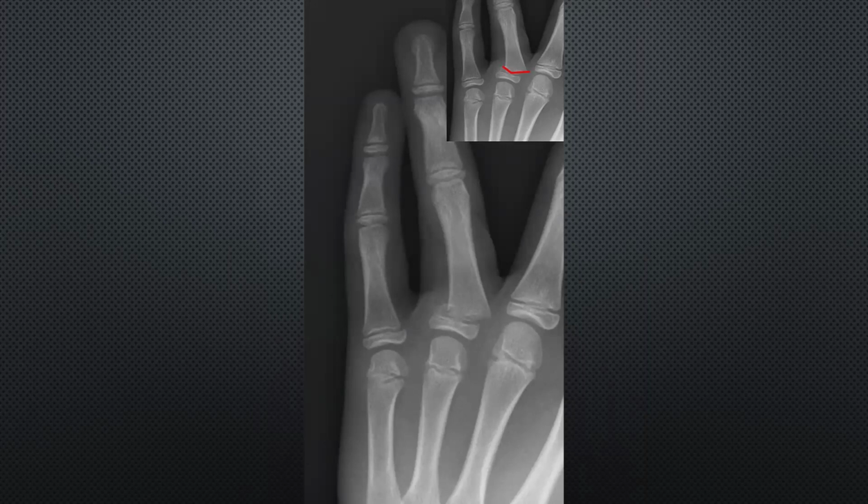It's an X-ray of the ring finger. Is it an X-ray of the wrist, elbow, hand, or ring finger? It's the ring finger. It means the one who did the X-ray targets the ring finger. He examined the wrist as normal, and all fingers as normal except the ring finger. That's why he did an X-ray for the ring finger only. Did you get my point?